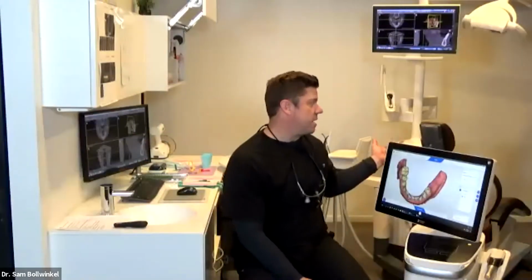We've got the treatment center. Behind me, we're going to show you a little bit of the treatment centers. The treatment center from Dentsply Sirona, if you're doing root canals, has an apex locator incorporated. It has my implant motor. It memorizes the patient's location. It has a massager in the chair. It's an amazing piece of technology for efficiencies and just patient interaction. All of them together are amazing. I would say do all of them. That's what I did. If I only had to choose one, I could only choose one.